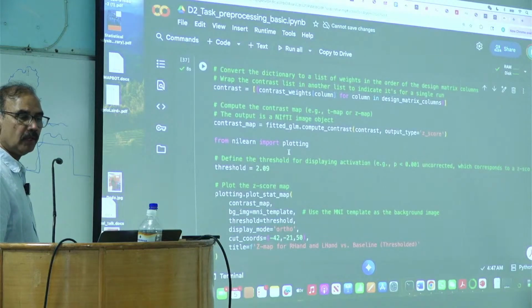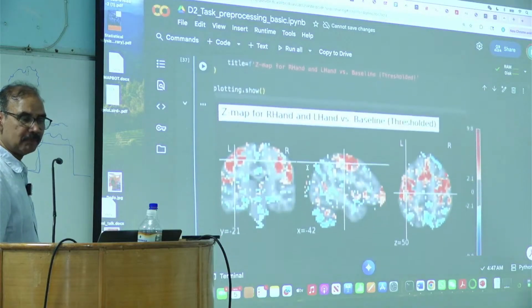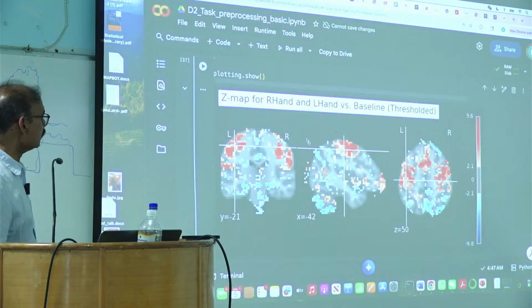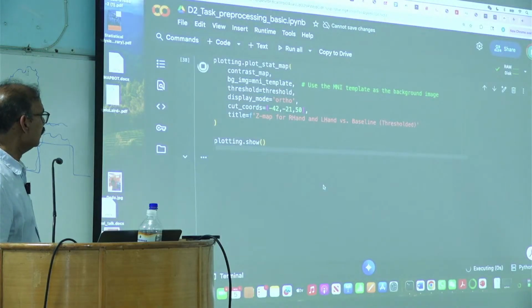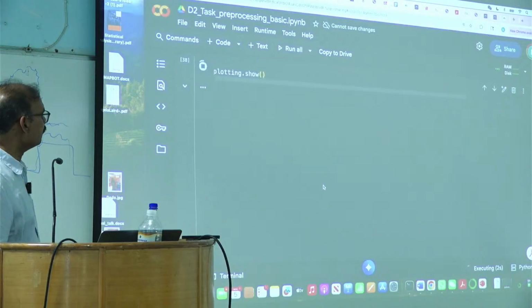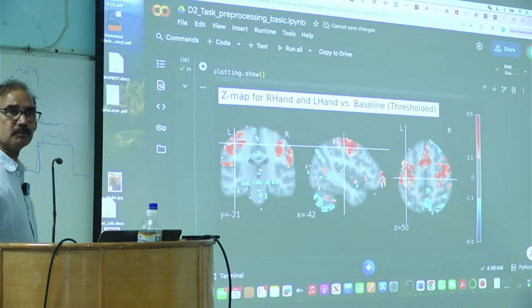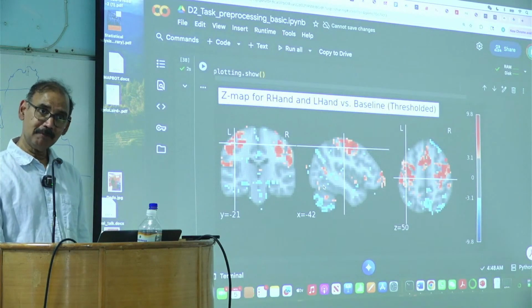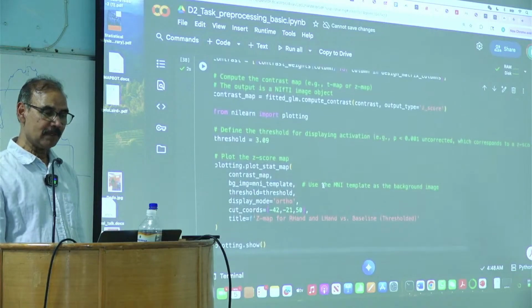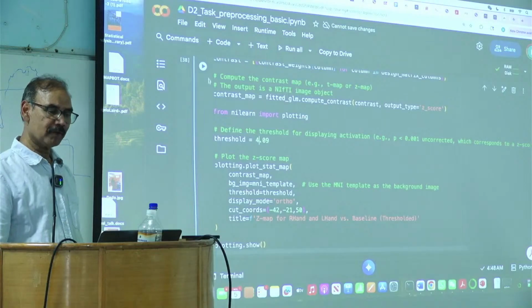This one uses a slightly higher threshold. Okay, all of you remember this? This is with threshold of 2. This is with threshold of 3. Which one would you use? Which one? 3? Let's say we made it 4.